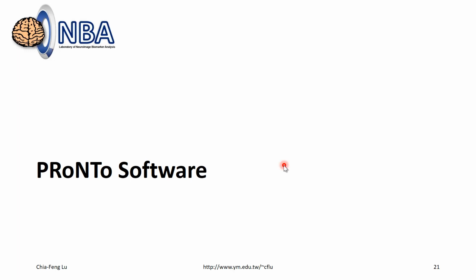In the second part, I'm going to introduce this toolbox or software called PRoNTo to you. This is actually, I think, the only one, or the very first one, to provide the GUI, graphical user interface, that can help you easily perform MVPA on your fMRI dataset.